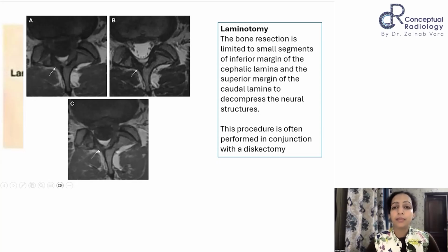The inferior aspect must be there, right? If it is the lower vertebra, then the inferior aspect must be there, so only the superior aspect will show like this. A hemilaminectomy will show complete absence of it, whereas only a portion will not be seen in cases of laminotomy.